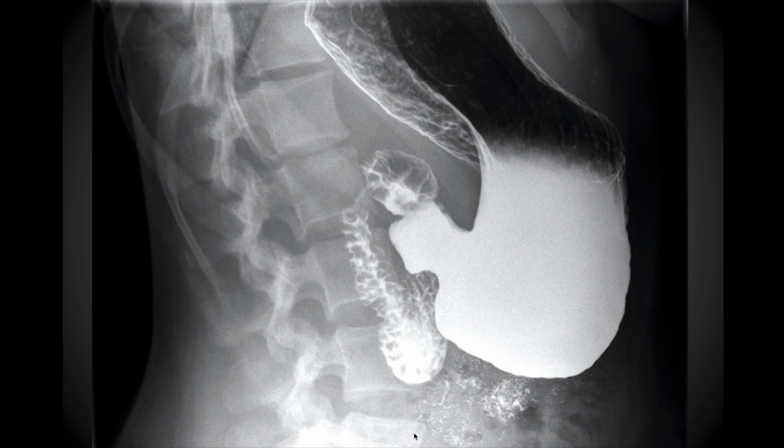so we're just going to go through a series of images in this patient. Once again, you can see the contrast agent here in the pyloric region. You can see the sphincter, where it's then moving into the duodenum down here. So this all represents the duodenum. Just to get you oriented a little bit as well, in case you're struggling with that, here is the spine, so you can see the vertebral bodies and the intervertebral foramina located right there. So again, this is posterior, this is anterior, and this is a lateral view.